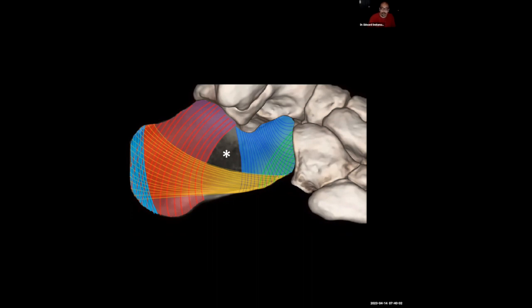So as you can imagine, with these polytrauma patients, high energy trauma patients, the talus is thought to act like a hatchet or an axe, cleaving at this relatively weak portion of the calcaneus, causing a lot of these calcaneal intra-articular fractures. So an area of sparse trabeculation between these blue, red, compressive trabeculae and these tensile, or what I've labeled here, these yellow trabeculae, internal trabeculae of the calcaneus.